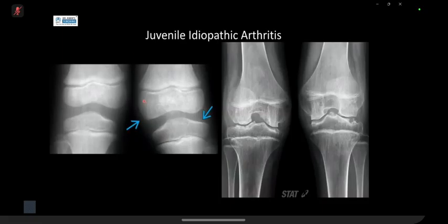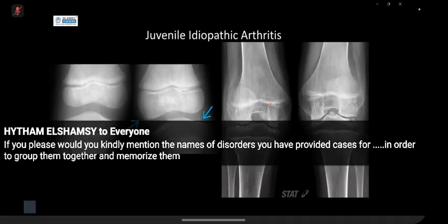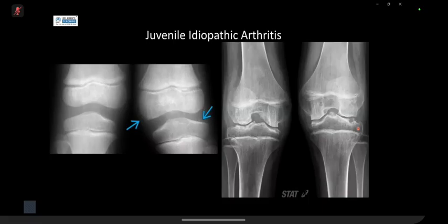So patient, both legs, one has more affected with arthritis on the left and not on the right. You can see the epiphysis is a lot bigger on the distal femur. And then this is one that has a bilateral JIA involvement of both knees, and you can see that widening of the intercondylar notch. To be fair, if you are just looking at symmetrical both sides without one to compare, then in the absence of other symptoms and purely isolated widened intercondylar notch, I think it's hard to pick up. Okay, and I often have to go back to compare it with age-matched controls to say, is it truly widened or is it just a projection thing?